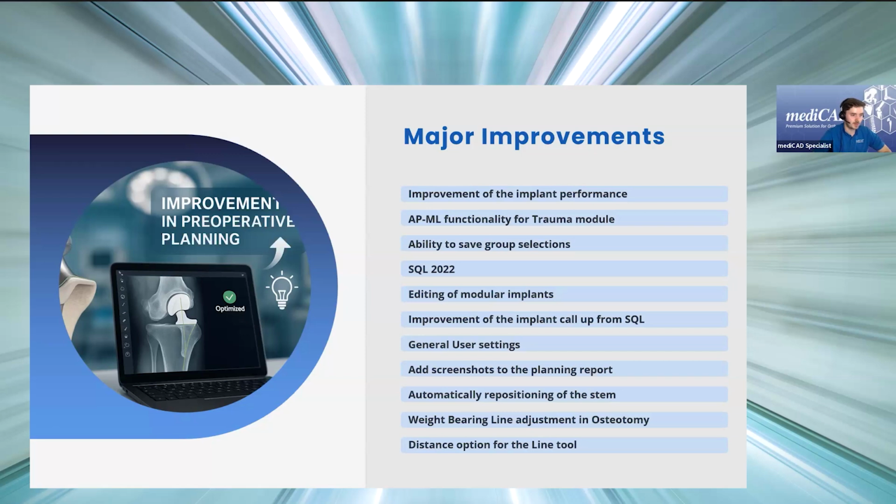Now, talking a little bit of what the goal for this update was, as with most of the 7.0 updates, since obviously the actual 7 update was the major upgrade, the minor updates from basically 7.04 until now have minor, sometimes even major improvements, but the focus is less on new modules or new measurements, but more improvement of usability, quality of life, a few features in there that generally makes the planning and templating much easier, especially when controlling multiple implant parts.